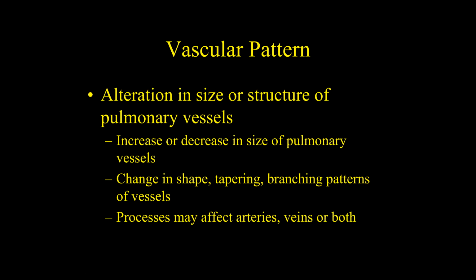Okay, so let's review. The first pattern that we talked about is a bronchial pattern. A bronchial pattern is recognized by tram lines or donuts in the periphery of the lung, not in the perihilar region. Typically, bronchial patterns are caused by allergic lung disease, parasitic lung disease causing an allergic response, feline asthma, and inhalation of irritants like chronic secondhand smoke.